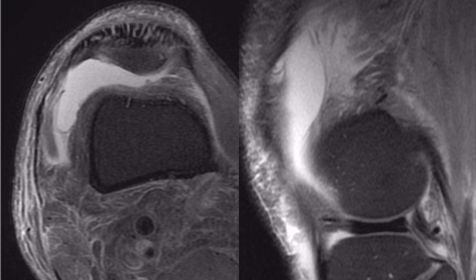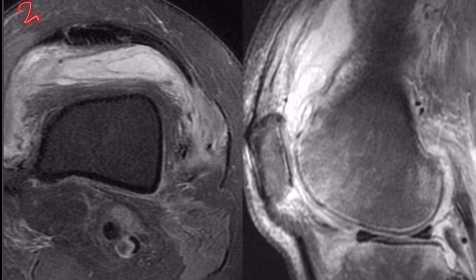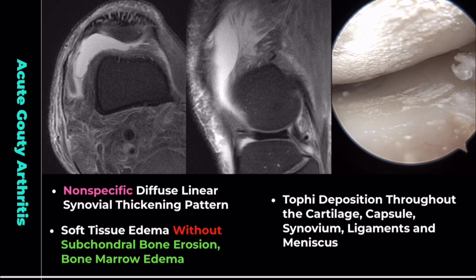Let's discuss two cases. Do you think both of these cases are septic arthritis? Let's examine them one by one. The first case is acute gouty arthritis.